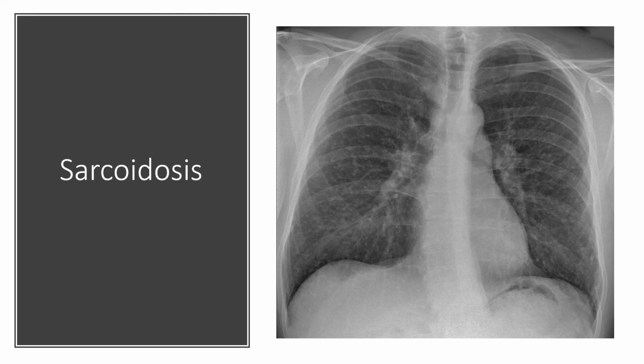Sarcoidosis is something as well that you would see with accentuated hilar areas, right? And so sarcoidosis also includes ground glass opacities. So GGOs is what they're called, ground glass opacities. And these look like someone crushed a bunch of glass into little pebbles and sort of threw them on the X-ray. So when you're looking at the interstitial space, you see how it looks like someone just threw specks of glass. So it looks very spotty, right?